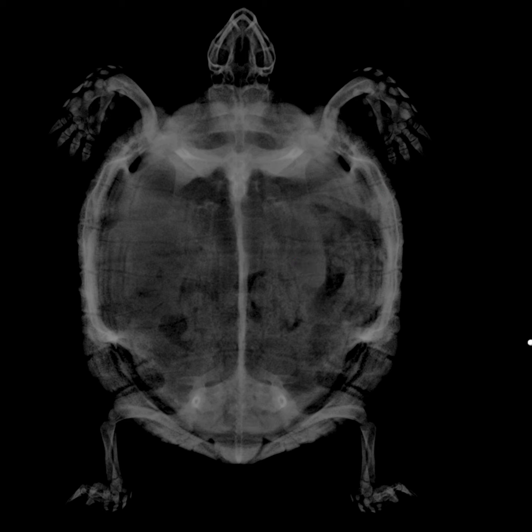Now, looking at the rest of the digestive tract in a chelonian can be challenging. Roughly, we have to remember that in the caudal left aspect, we expect to have the descending colon. In the caudal right aspect, we have to expect the ascending colon and the cecum, and in the center, we have the jejunum.